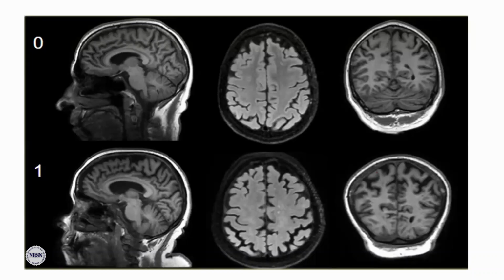So if you're taking sagittal and you see a Koedam of 2, the highest level of atrophy is 2. That is the score for that particular image. So you don't go and say there's 0 for sagittal, 1 for axial, and 2 for coronal. If it is coronal that we are saying a Koedam score of 2, then we are going to assign it that score. So basically, the images labeled as 0 are just telling us that there is no cortical atrophy. So the sulci are closed.